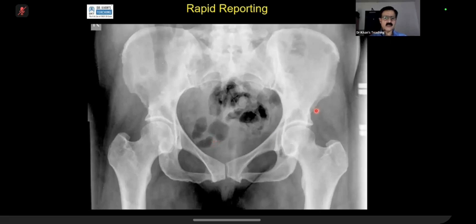Now, if you look carefully, look at this iliac. In the pelvis, the key thing is to compare right and left side. Somebody who was comparing right femur with left femur, well done. So that's the good way. But if you see, you can look at this area, look at the trabeculae, then look at this one. It's a definite finding. It is a subtle finding, but definite. So this is the type of case for which you have to develop your eyes for the exam. I'll show you 3-4 like this today.